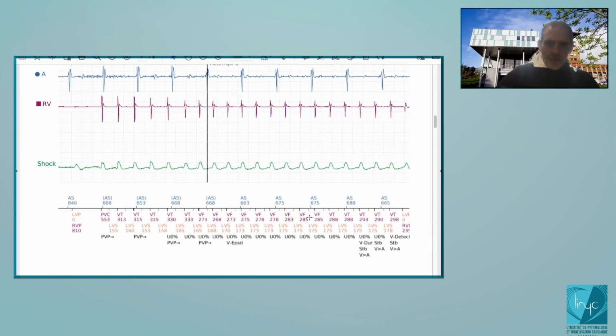Yes. But now what you see here is V duration. V duration means that for any reason in this patient, the initial duration for the VT zone has been programmed quite short, something like 2 seconds, or 2.5 seconds. So you arrive at the end of the duration for the VT zone. But once more, V more than A, so you could treat at this time with an ATP, but you cannot since the VF duration is still ongoing. You understand?